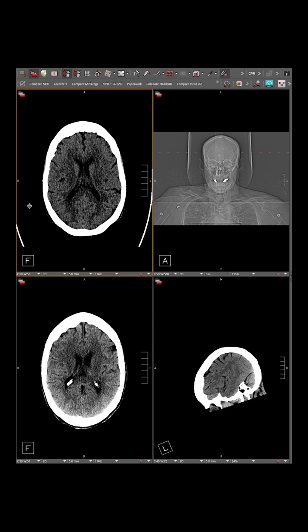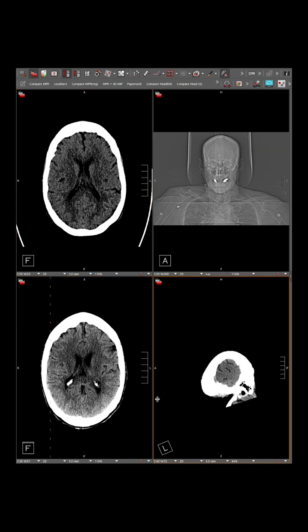I can't remember which. Those will also save it into the screenshots view within PACS, and I've cropped out for this view the little bar at the bottom, which would be down below here, with all of the sequences or projections, just because there are some study dates and potential PHI down there, but that'll save it. If you do some of those, it'll also save it to a screenshots set of images, which is particularly helpful.